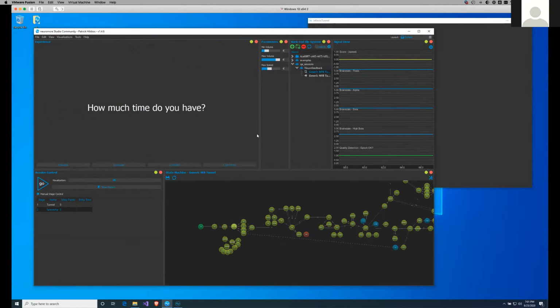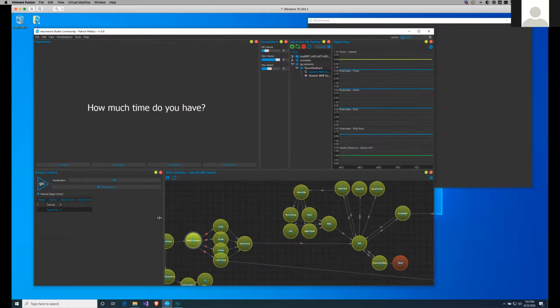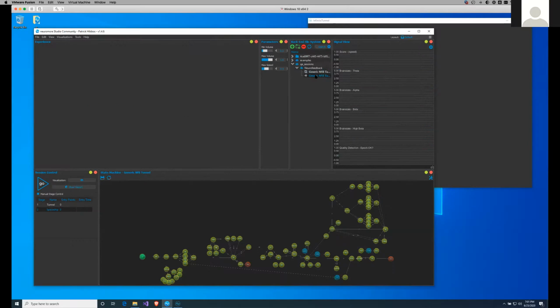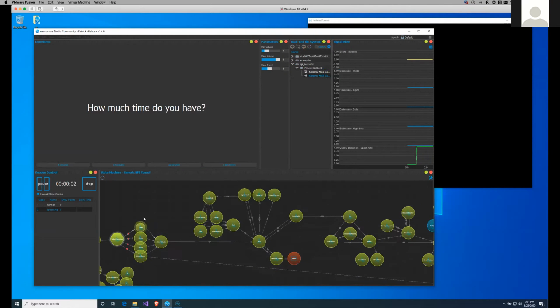So yeah, what Andy just mentioned. Here, now the whole thing is active, so we see that we're currently here. Let's replay the whole thing. Let's reload it. Bam. Here we are, session control started. All right, now we're here in that state.